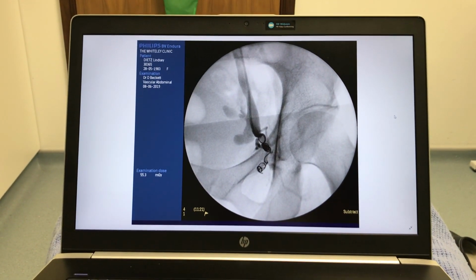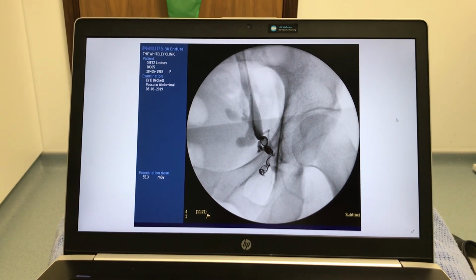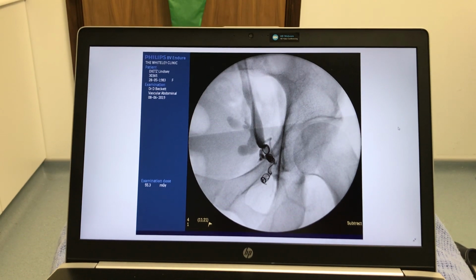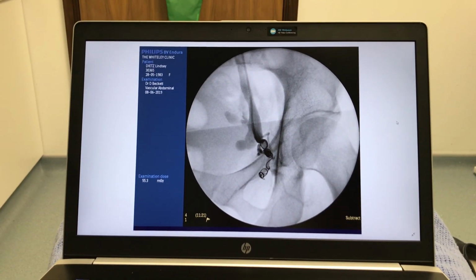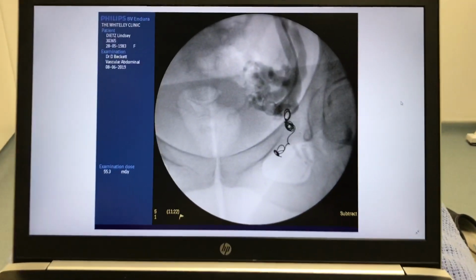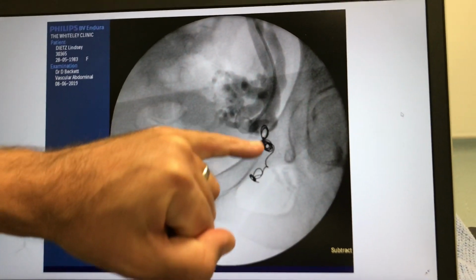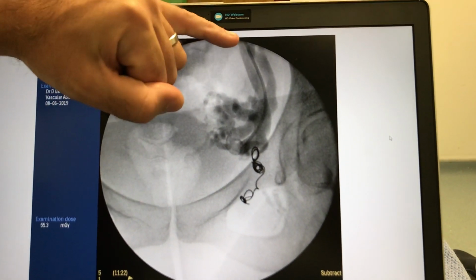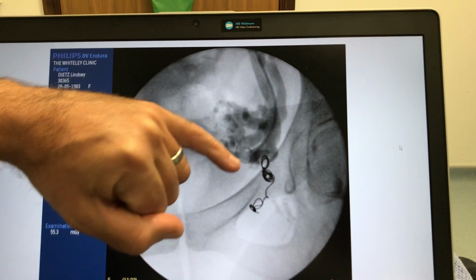Okay. Now the obturator vein is probably more important in people who've got reflux within the legs, but we know that it was refluxing in you as well. So we're taking a holistic approach here, and we're treating everything that was seen on the ultrasound effectively. So that picture there now shows that vein, which was the obturator vein, has got the coil in as well, and that's blocked.